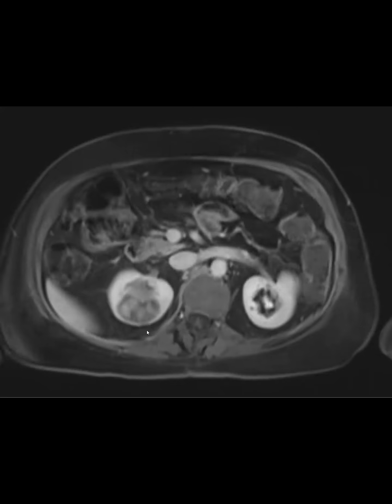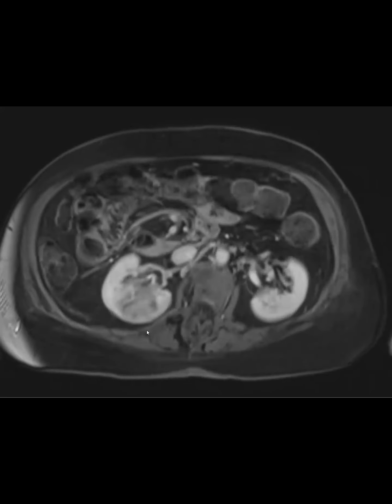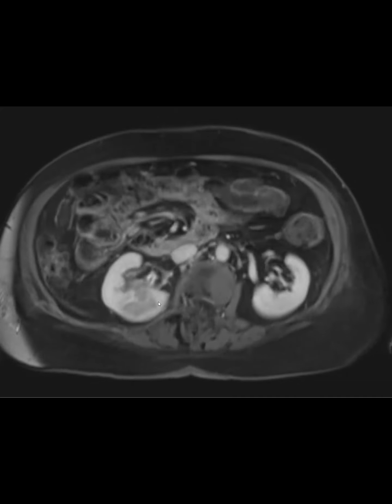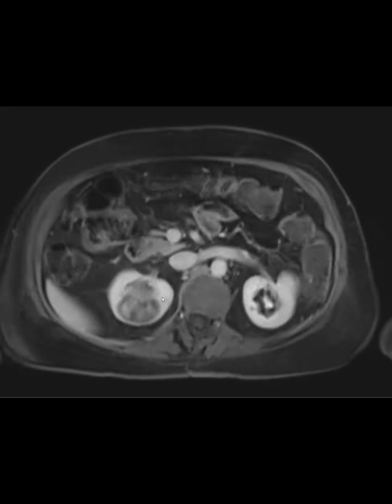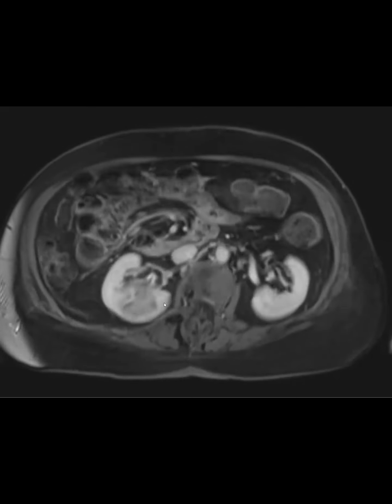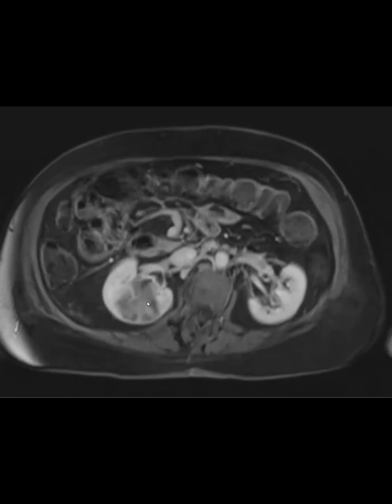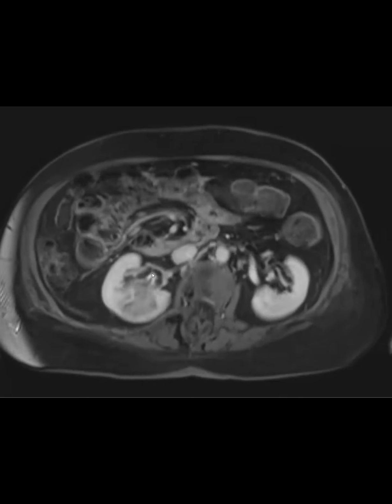It's solid. Does it go down the actual pelvis? Enhanced, I think. So I would try to point out here, the calyx is sort of here and enhancing, and then kind of cupping this thing, right? That makes it more like the urothelial, if that's getting that far down. Yeah, so that's one thing that for me would suggest it's more urothelial.